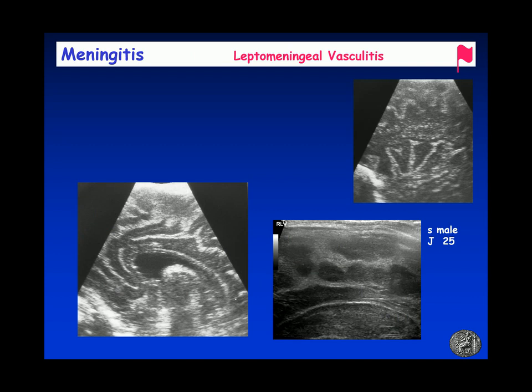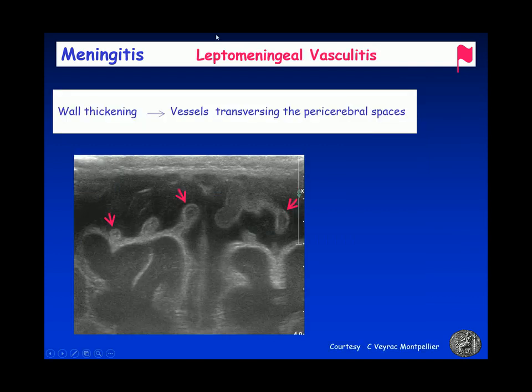So, what happens if you use state-of-the-art ultrasound? You know that as pediatric radiologists, we use a lot of ultrasound. This is the best tool to approach a pathology in a child. And this applies not only to the abdomen, but also to the brain. We are going from the anterior fontanelle, the posterior fontanelle, the mastoid fontanelle, you name it. We use state-of-the-art technique and we can explore the brain perfectly well.